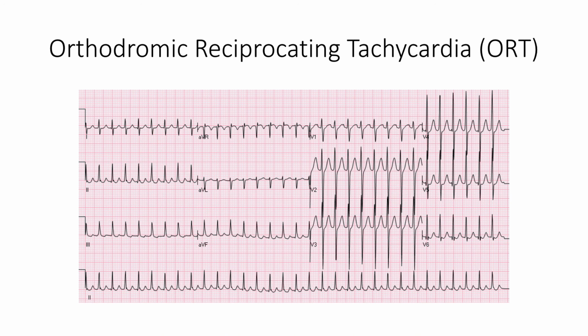However, some patients do develop palpitations and do develop an underlying supraventricular tachycardia. And so this is an example of AV reciprocating tachycardia. And we call it orthodromic reciprocating because it's coming down the AV node and then up the accessory pathway. And because it's going in the normal direction, then we have a narrow QRS.